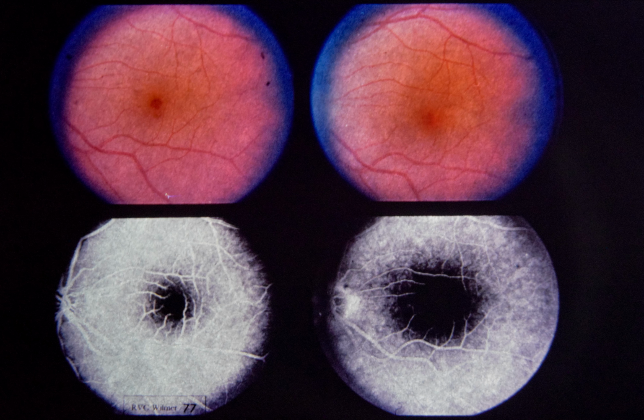One month later, the hemorrhage had resolved entirely, as seen upper right, and vision had returned to 20/20. The fluorescein angiogram shown below shows no abnormality in retinal vessels. Lower left, note macular hemorrhage blocks choroidal fluorescence. 10 minutes after injection, lower right, note absence of dye leakage. This patient has been followed without recurrence for 2 years.